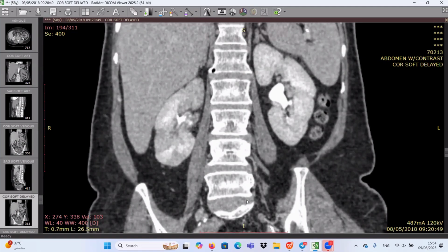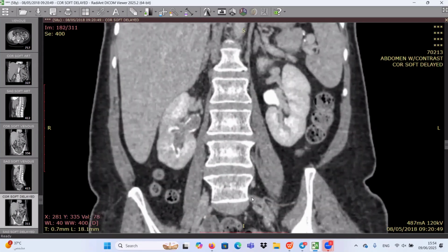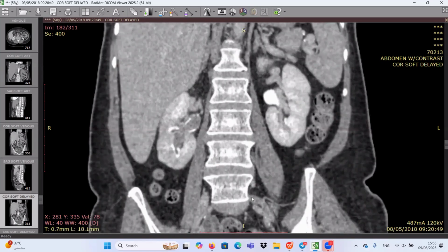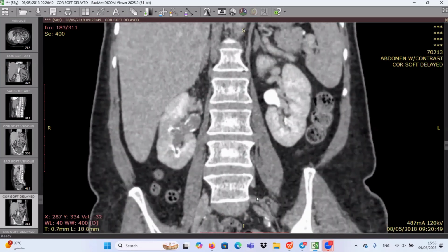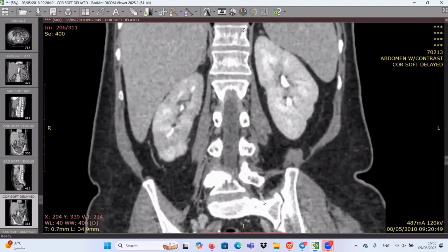Yes, you are right. You did very well. You mentioned 3 main differential diagnoses at this point: maybe acute obstruction, maybe acute pyelonephritis, maybe renal infarcts. But how can we explain these filling defects inside the renal pelvis and calyceal group? Yes, it is non-enhancing, and it appeared to be of a soft tissue density.